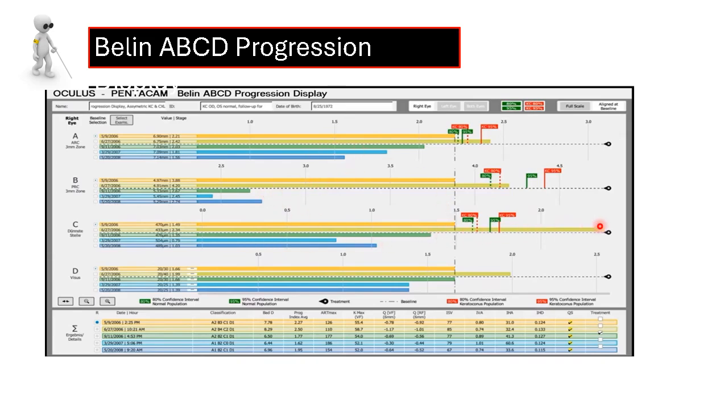For example, if you see here, in one of these visits, he has a marked decrease in the thickness of the cornea. So this indicates that this patient crossed the red flag here. So he's at risk of severe thinning of the cornea. Similarly, in this visit, he has an increase in the curvature of the posterior surface of the cornea, and he has crossed the red flag. So with a patient like this, the doctor should decide when to intervene to arrest the disease based on his age and the thickness of the cornea, whether to do cross-linking or intracorneal rings. This depends on the doctor's opinion.